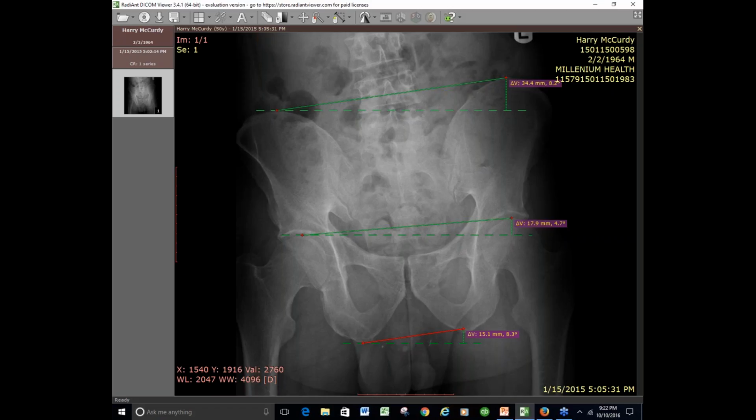Right? That's exactly it. So what's really happening here is when I have a big leg length inequality and I push this up 4.5 degrees or whatever it is, this, because it's a wider measurement, is going to be pushed up further than this, which is a closer measurement, if you just measured distance.